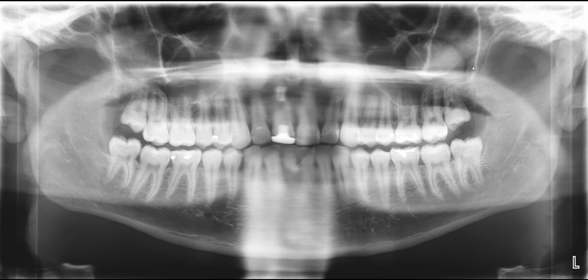Another side note that you may be able to see, which I'm actually going to create another full video on, is if you pay close attention to the anterior maxilla and mandible, you can see that you have a much harder time visualizing the apex of 25. So is 25 missing? Okay, you are not seeing the root of 25, right? And also look at number 9. It's endodontically treated with some type of opaque filling material in the apex. So given what you see, what do you think might have happened?